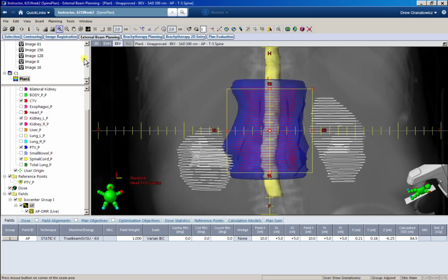I'm going to uncheck the zoom. You can see I still have my magnifier open. I'm going to uncheck that, which then will let me drag these around. You can do this manually like I'm doing right now, drag those around.